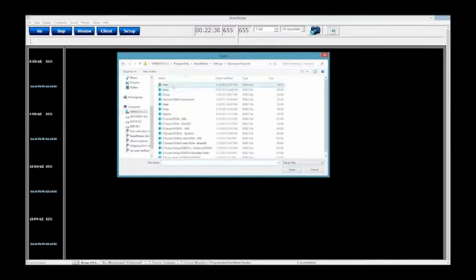Now, there is a reason that we have them outside the file folders too, and that's because the classic way of using the read/write settings files don't see those settings when they're inside directories like that. But I personally like the file folder system. It keeps your protocols a little bit more organized, and you can have them with different styles. You can even go through subdirectories if you really wanted to, making ZScores or making BrainDx ZScores and other things like that.